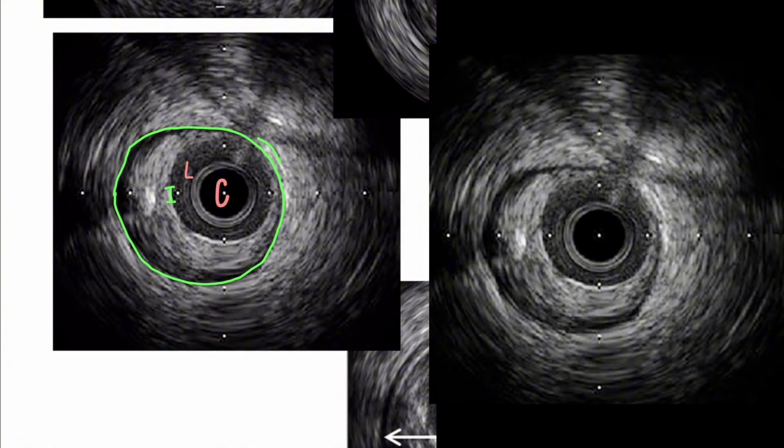And in some areas, like over here, you're guessing a little bit because you can't really see a distinct black line. So remember, that's the media. And then the white, which is where I just drew my M, but immediately after that black is the start of the adventitia. Okay, but remember, if this is the lumen and the intima, what's between the purple and the green line?